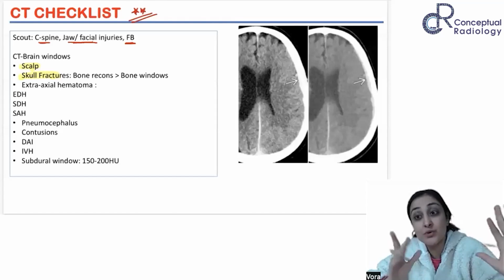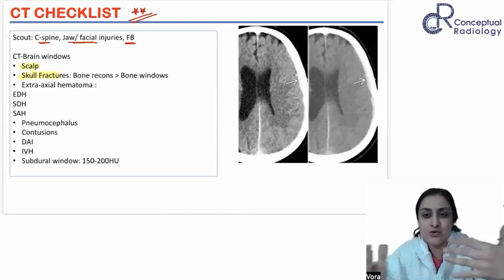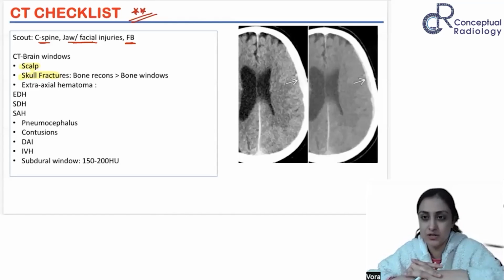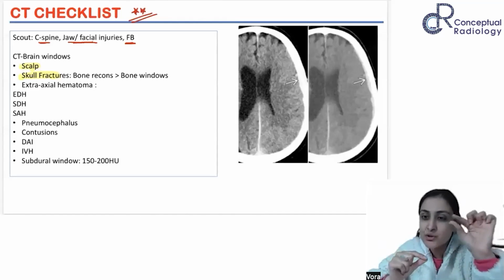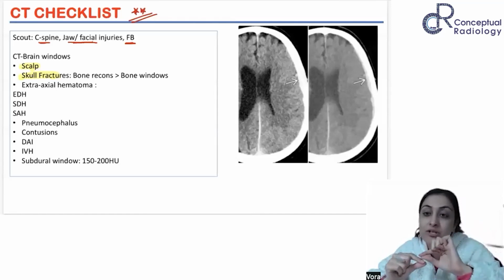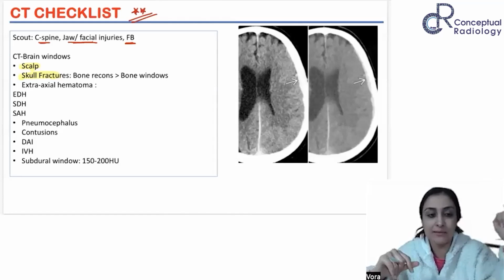Okay, so this is something you should know: 5 mm में हम acquire करते, we see 2.5 mm recons, but you can also get 1.5 mm thin recons if requested. In addition to the brain window, the soft tissue window, you will also get bone recons जो higher hard होते हैं, right? We'll have some basic discussion on this also. What are different recons? Reconstructions is what I mean by recons.